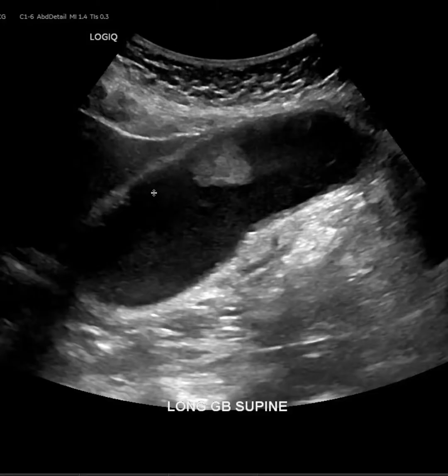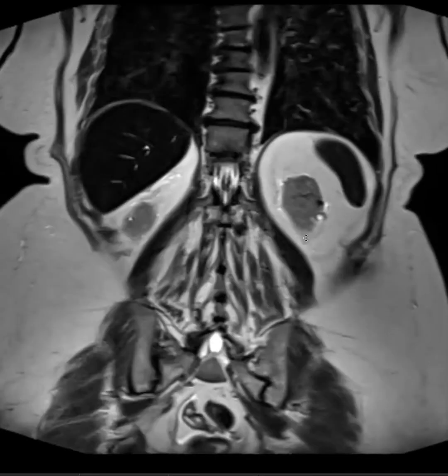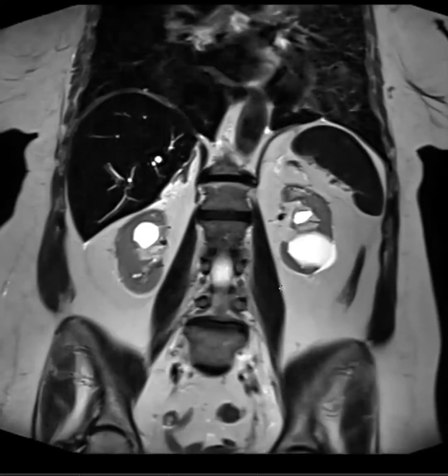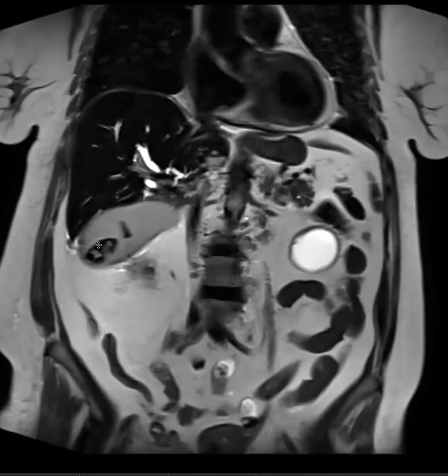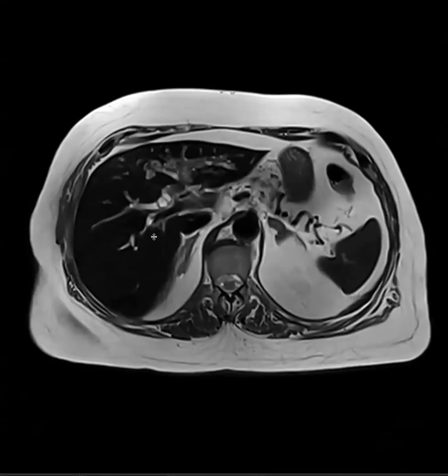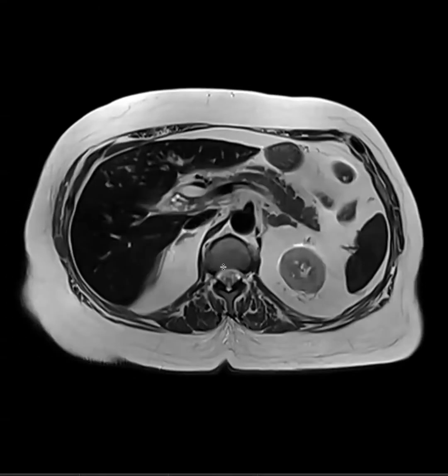Then they got an MRI, and this is what the MRI showed. The patient has renal failure, and so has iron deposition in the liver and spleen, and has gallstones, and the mass is there. You can see it better on the axials. But there's more than gallbladder findings. So there's the mass, these are the stones, and then there's all this other stuff.